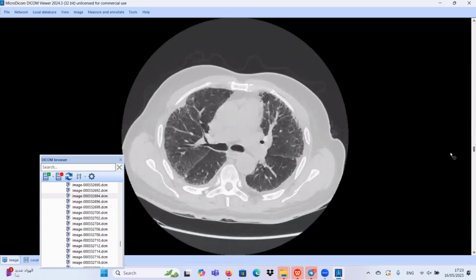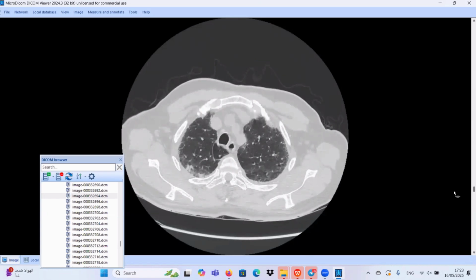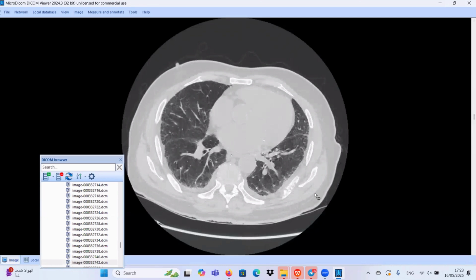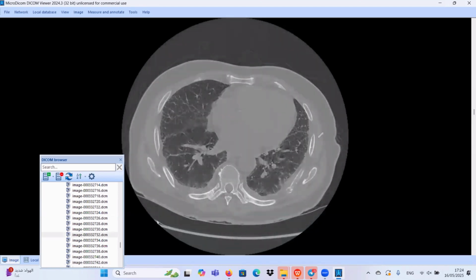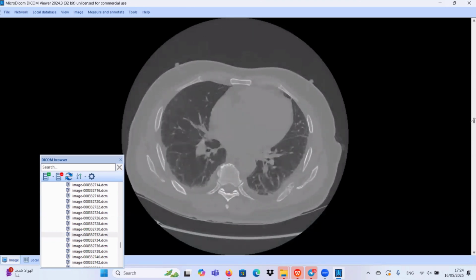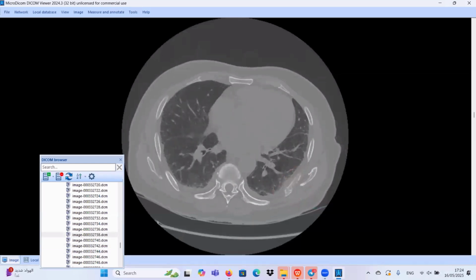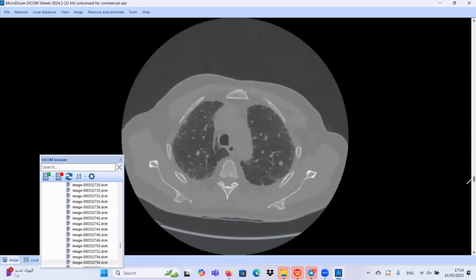And also, don't forget to check the bone, please. The bone and vessels. If you check the bone, you will find here lytic erosion. There's erosion. Yeah, we have here an aggressive osteolytic lesion at this rib. Maybe something like metastatic lesion.